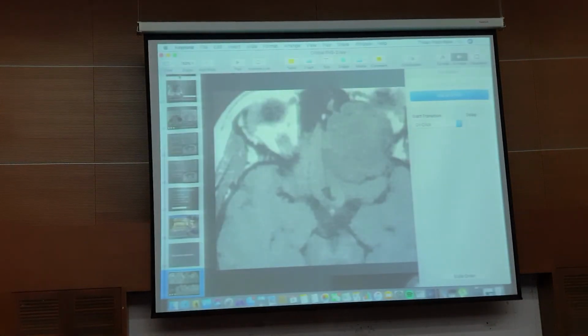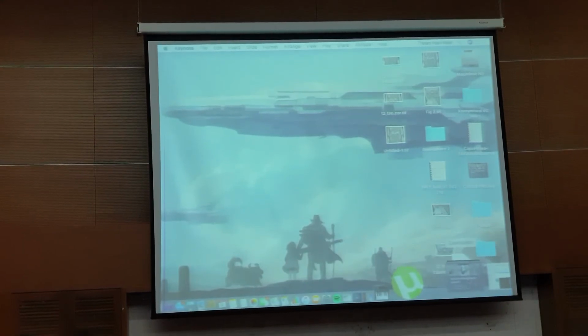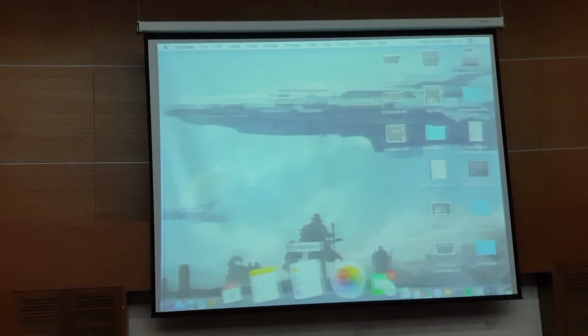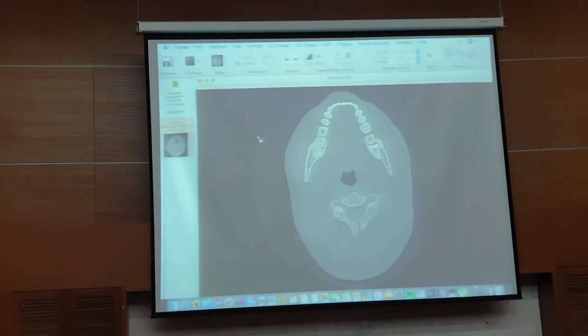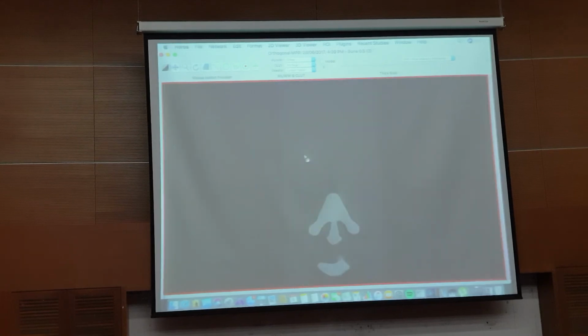So let's go back to the sinus CT just now and see whether you can see more. Why don't you shout out what you see the moment you see it? Then you can impress the professor.